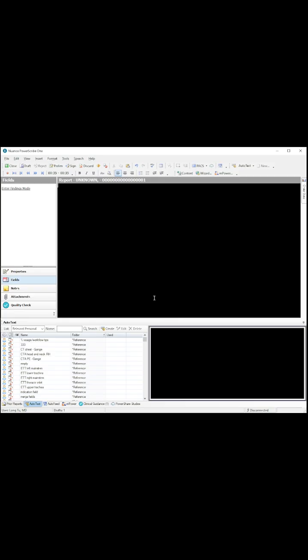As you can see, some of this has some inbuilt functionality. It has pick lists and empty fields which you can fill in with text. That is something that we'll cover in a different video. But to briefly recap, there are two major approaches to creating a macro, and therefore minimizing the free dictation you have to do. You can just highlight text and say macro that, or you can go in directly through the auto text editor and create a macro.